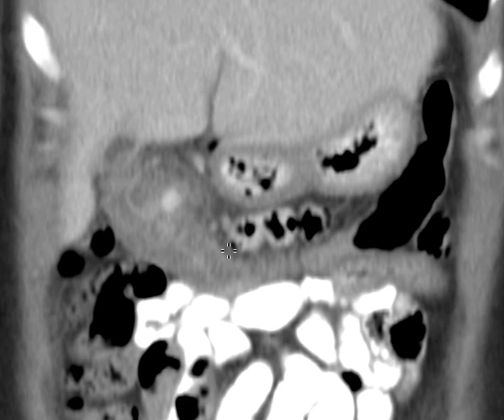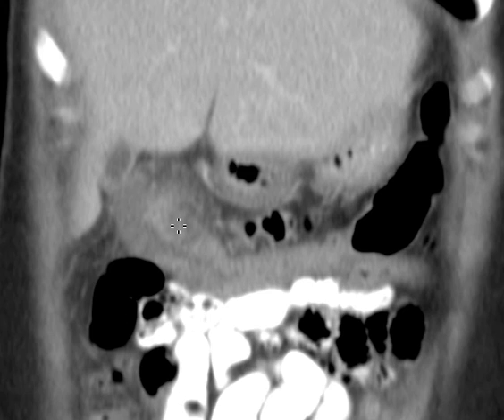You see how the colon has this margin here and then it bumps into that? So it's actually extending a little bit beyond what would be the confines of the colon wall here, and you have quite a bit of edema there, and the colon mucosa is all quite edematous there. And then here you can see it kind of transitioning to a more normal distal transverse colon.